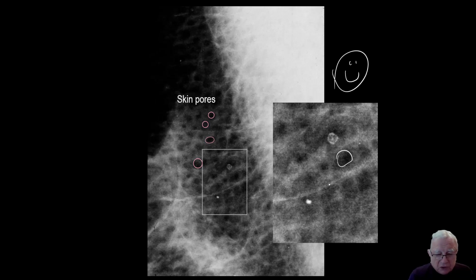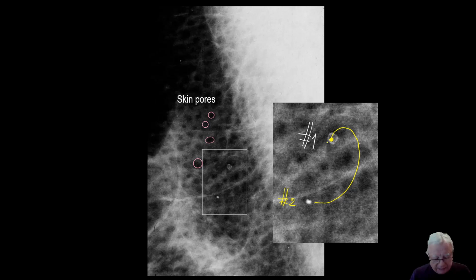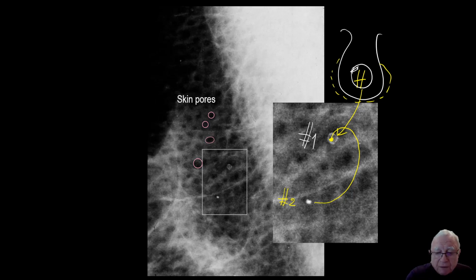And for whatever reason, the sebaceous gland is going to calcify. There will be two different patterns. Nothing more. And you just pick this up and you can put it right in the middle of this one. That is, either the wall of the bag that is calcified, so we get this hollow calcification, or the content calcifies, and that's why we get this tiny little pearl. So you see how efficiently and fast I arrived at the diagnosis.